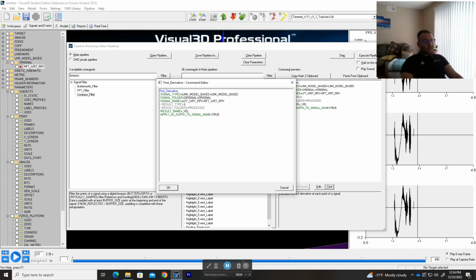And you do that by adding a plus sign, and then again you do the same thing again. So you type the type, and then type the signal folder, and then type the signal name. And then when you keep these like this, it will automatically create a folder called processed within that same place. If you keep it. Otherwise you can give it like a new type, it doesn't matter. You can create a completely new folder, you can add it to an already created folder, and so on.